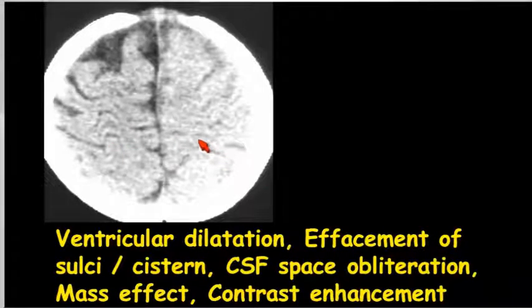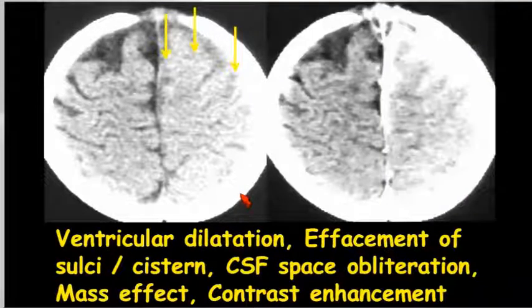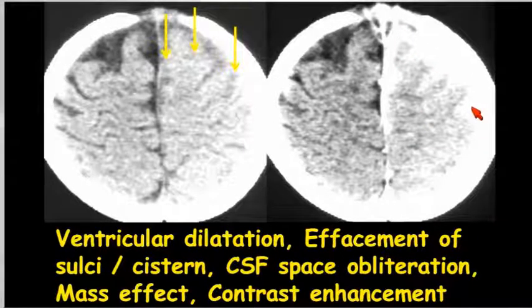These are obviously very asymmetrical. So the question is, is this swelling from the inside out? Is there an isodense subdural or something? Or is something filling the leptomeninges in an isodense kind of way? And so in the context of infection, we would then add contrast, and here we can now more directly see the enhancement. Again, you have polymorphonuclear leukocytes in here.